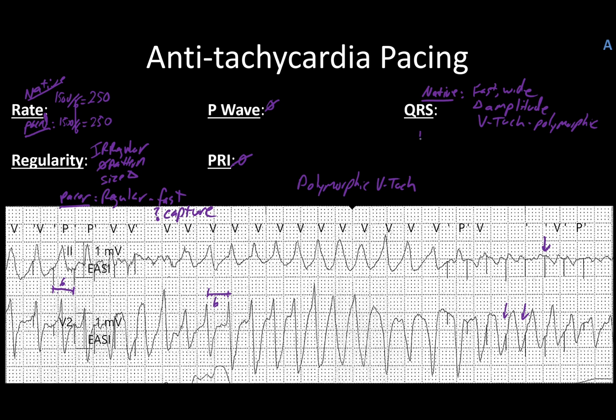As for the paced beats, we can say that we have single spikes, but they don't equal any kind of a QRS at all that we can determine. In fact, our best guess is that it has no control or capture.